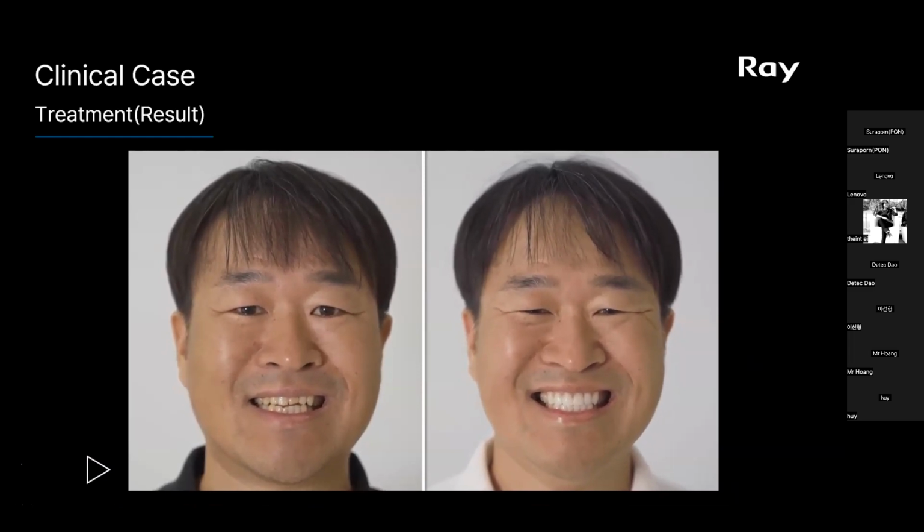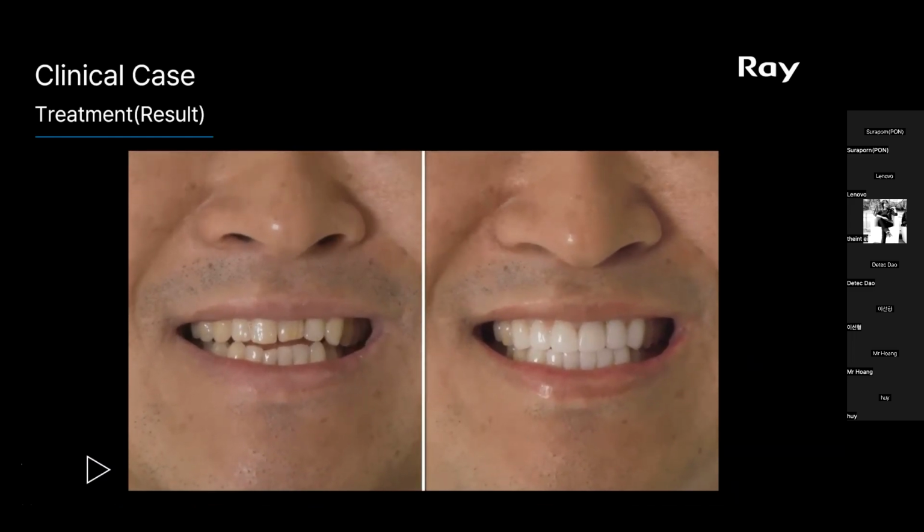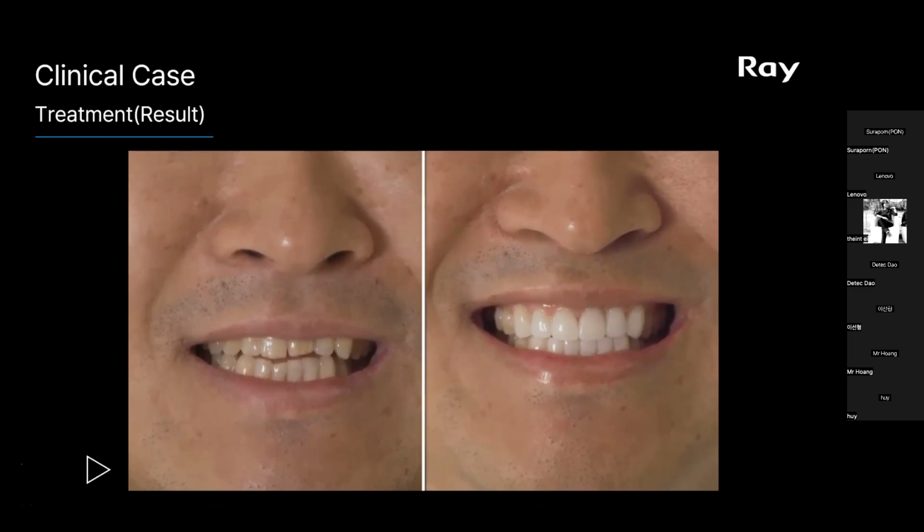So the RayFace can connect two different kinds of patients. For the patient who wants to do the orthodontic treatment, the color and the shape cannot be changed. So after the orthodontic treatment, the patient would not be satisfied because the original teeth are ugly. So you can easily convince the patient to do more treatment with the veneer.